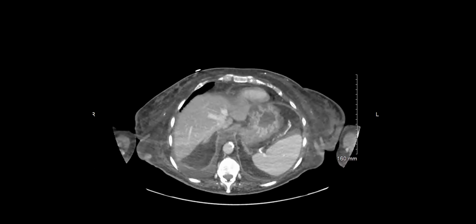In retrospect, when I look at those images, unlike TCC, the density looks different. It looks kind of hypo, and then kind of heterogeneous. Whereas the bladder cancers that I've seen, if there's wall, then it's wall thickening and enhancement, or papillary. This one has an interesting growth to it. Anyways, I don't think we can call it prospectively ever.